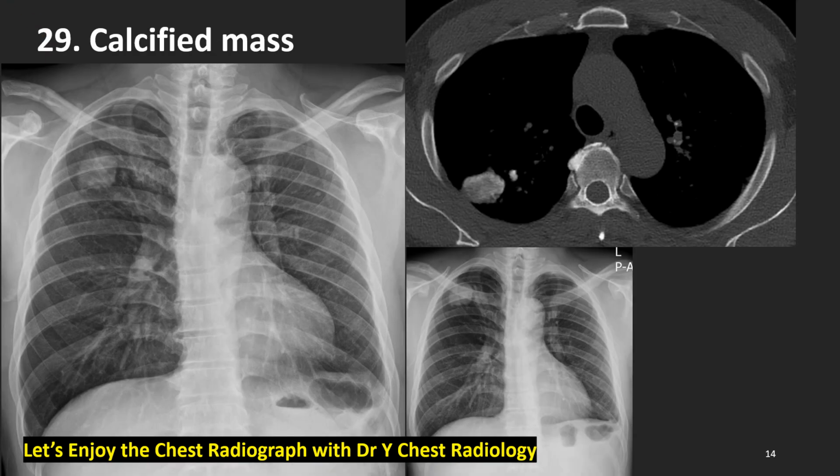How about this middle-aged man's film? 3 centimeter dense mass in right upper lobe. What else can we see? Yes, left hilum is elevated, and there are many well-defined small nodules with calcifications in left upper lobe. And the left side diaphragmatic pleura is thickened and deformed.